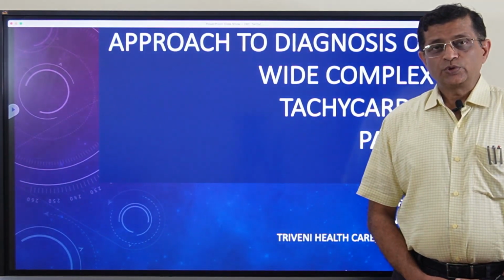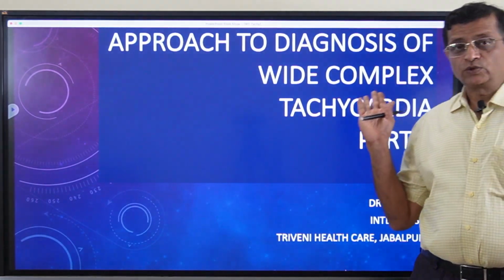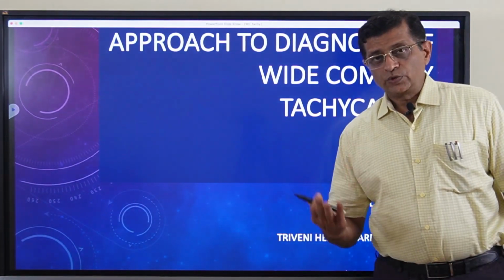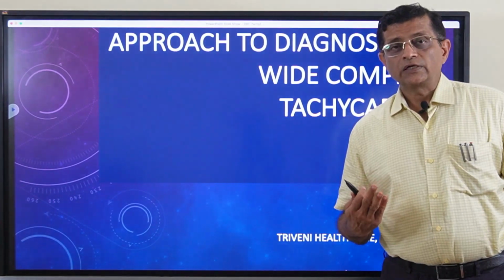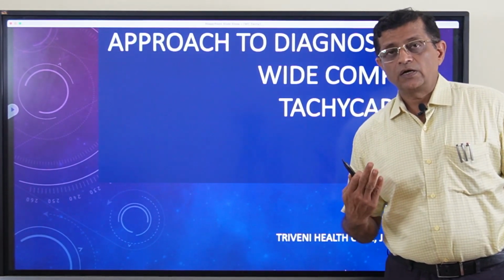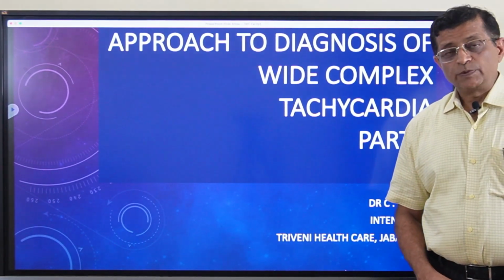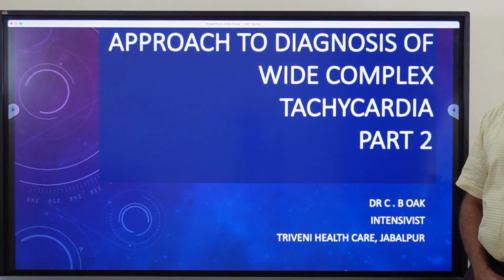In the last tutorial we discussed part 1 of the approach to diagnosis of wide complex tachycardia. We will continue this lecture today and discuss a few algorithms that help us to diagnose a wide complex tachycardia, as to whether it is VT or supraventricular tachycardia. So let's begin. Approach to diagnosis of wide complex tachycardia, part 2.